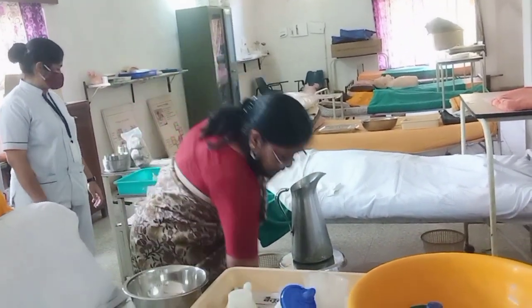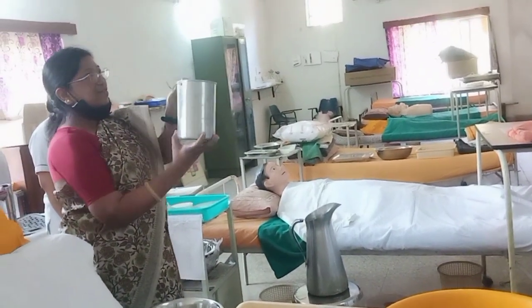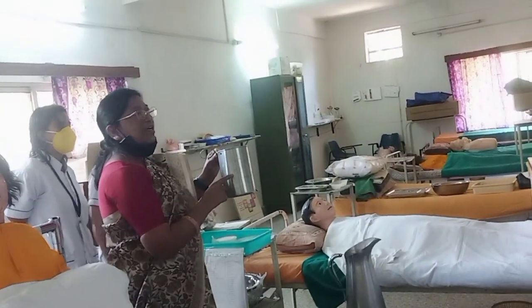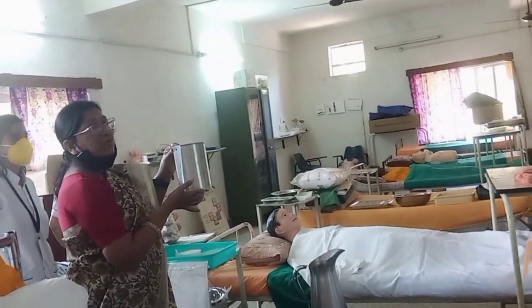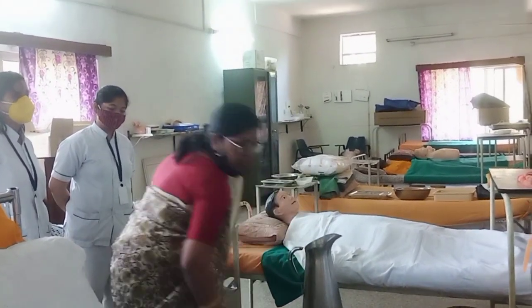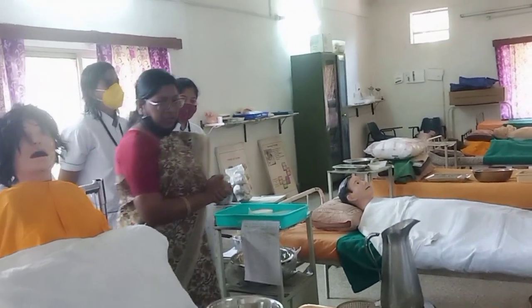And this one is an enema can. At the time when the doctor orders an enema for the patient, we have to use the enema can properly. You will learn how to use the enema can for the patient. Can I ask you some questions now?